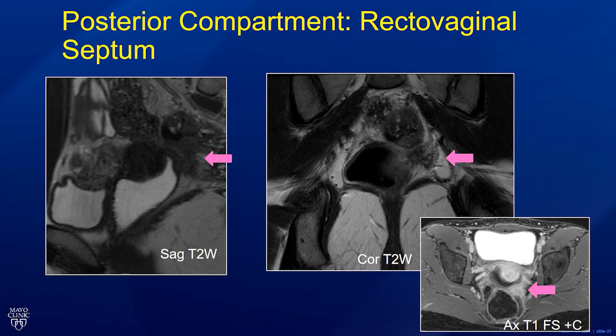So this is a complex lesion that requires very accurate description for surgical planning. Again, this is below the posterior cul-de-sac peritoneal lining, so the MR and the dictation has to be explicit, otherwise this could be missed laparoscopically.